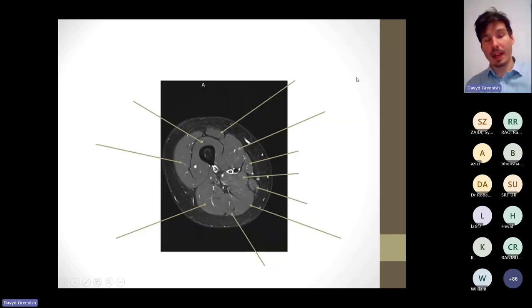Okay, we're coming down the leg a little bit now. Karen was talking about arm versus leg earlier. We can't see any of the body here. If we think in the arm, could this be an odd presentation of an arm? I don't think that we would say that because, in the back here, we've got 4 separate muscles, so it can't be triceps. It doesn't look like biceps either. So this is in the leg.